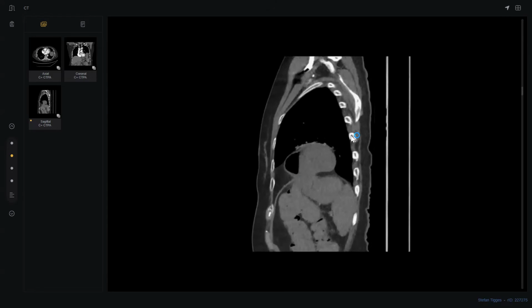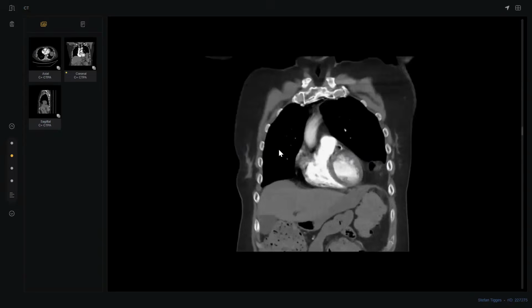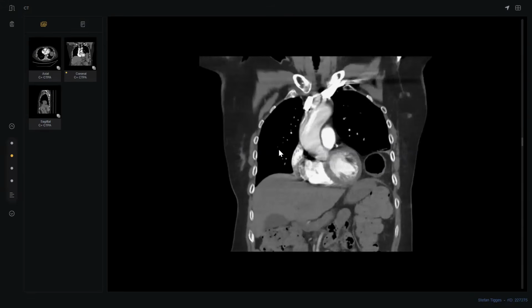Compare the wall here with the rest of the organs. Why can't you see enhancement in the bowel? I have to look at the visible branches of the aorta, just to look at if there is any thrombosis. Sir, it's not scrolling again.